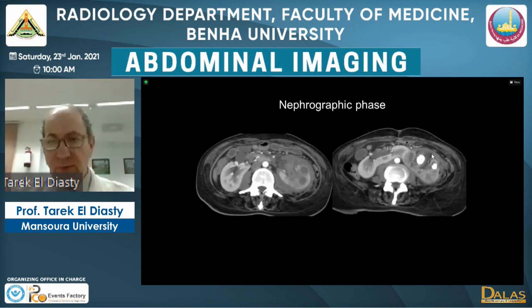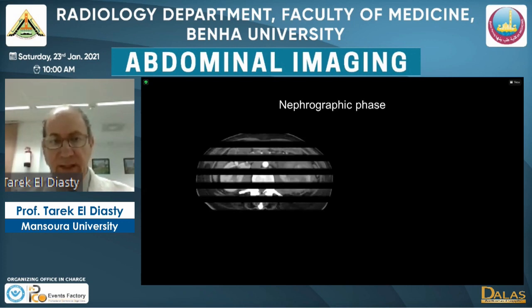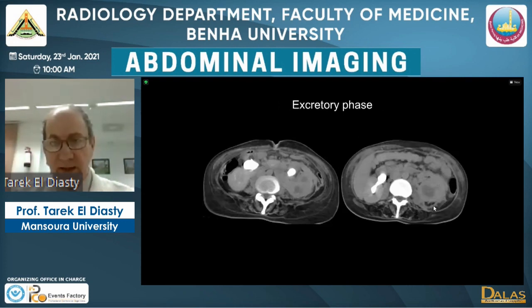And we can notice also this significant perinephric reaction here surrounding the kidney with thickening of the fascial planes here in the early phase, also in the excretory phase image. So the diagnosis of such a case is xanthogranulomatous pyelonephritis in the left compartment of a horseshoe kidney.